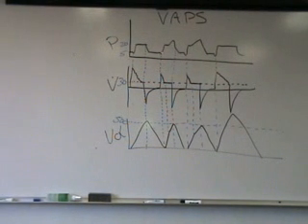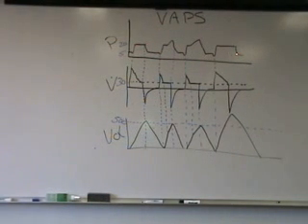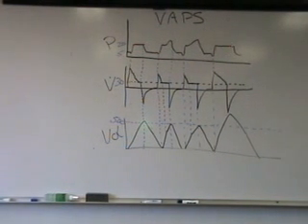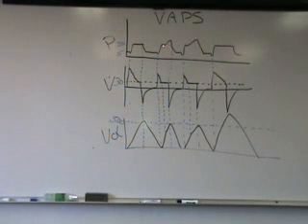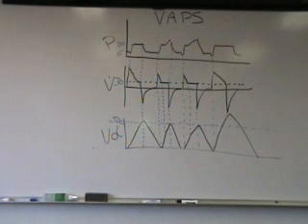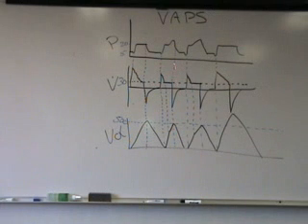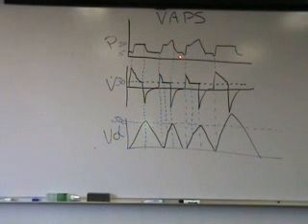And look what happens to your pressure scalar. No longer is it square, as you would see in breath 1 and breath 4, but now you see that the pressure scalar goes up, much like a volume control pressure scalar would go up. As soon as the volume is achieved, the volume says cycle off, and therefore the breath comes back down.